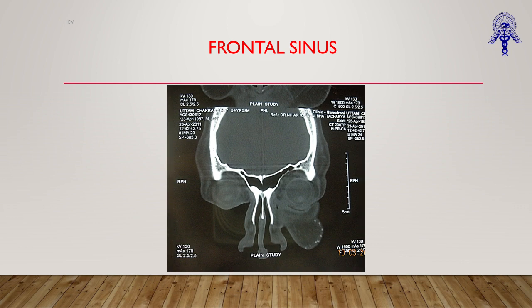And that's how, after doing the initial evaluation of the coronal scan, it's like scanning what is there, what is gross there, and wherever there is disease, you go back thoroughly, and when you assess the frontal recess, you go from posterior to anterior. Initially you have done an anterior to posterior scanning, which is just like a scan. I came here and saw what is going on, where everyone is sitting, saw that there is some trouble here, then I go there, and then for the frontal recess, if I look at the coronal scans posterior to anterior, I can understand the anatomy, followed by the sagittal, because then I will see the posterior group of cells also.